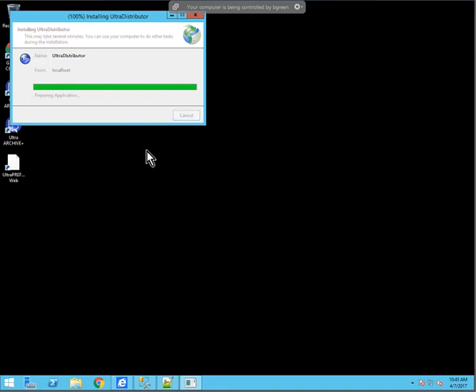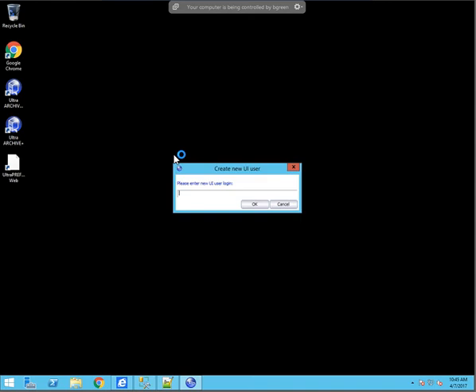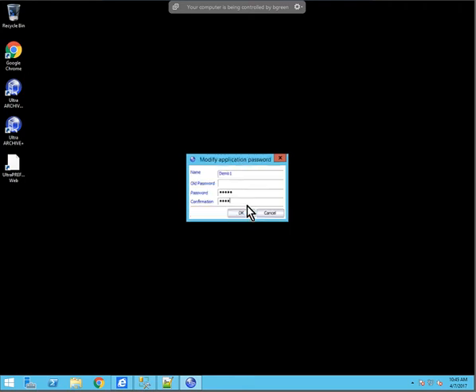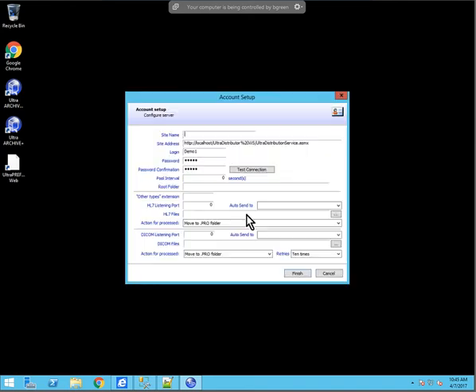Do click once, and then you'll get a box to ask you for a new user for the UI. This user for the UI is required for the encryption in the local file system. So I'm just going to keep it simple. I always just tell customers use the same username and password that you use for Distributor. And then you just have to confirm the password one time.